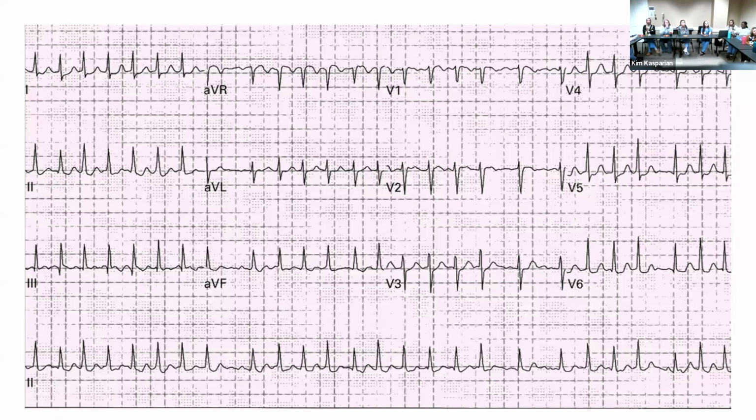And then it looks like, going off of just that isoelectric line, it's hard to say. There's some places you might be able to make an argument that there's something that looks like a P wave, but a lot of places not, right? Yeah. So it's irregular and I can't really find a P wave.